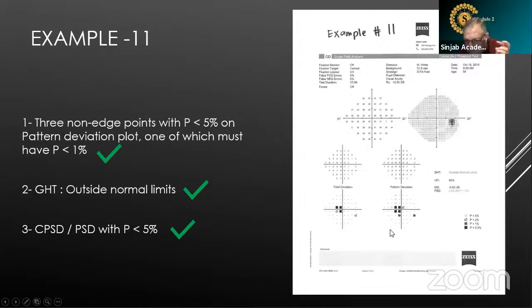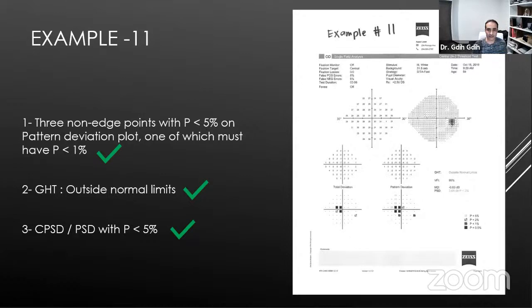Just a second. It shows less than, but for the first one, the 3 non-edge points, they should be in an area where we expect that it is glaucoma, but here it is central. Do we expect that? Good point. Well, like this, it could be glaucoma. It could be glaucoma if you have a low tension glaucoma with a central pit.